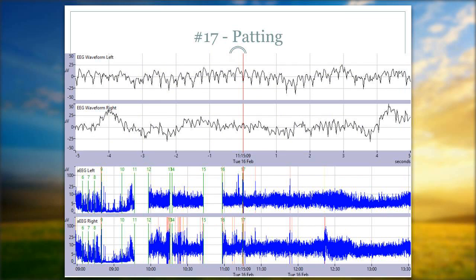And the last one I want to show you is not anything that's caused by equipment or by the brain, but by us. And so this is actually someone patting the baby. And again, with our brains device, we don't have video. So unless someone documents clinically relevant events like giving medication, doing cares, turning, changing modes of ventilation, all of that documentation is so helpful when we go back to review the aEEG.